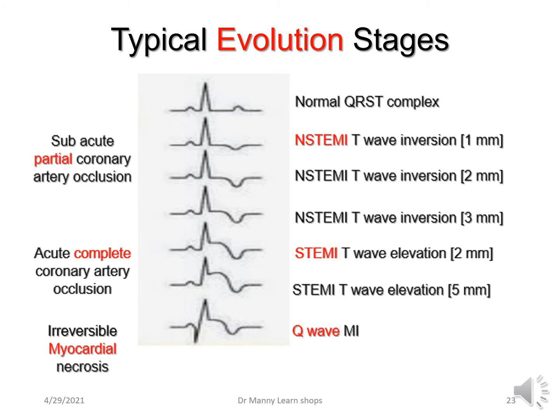And I've just put it here to give it a picture. So the non-STEMI T-wave inversion, you've got there a little bit of a bump, negative deflection, 1 millimetre below the isoelectric line. This can get worse, 2 millimetres, and even 3, 4, 5, 6 millimetres below the isoelectric line. T-wave inversion, which can be asymmetrical or it can be symmetrical.